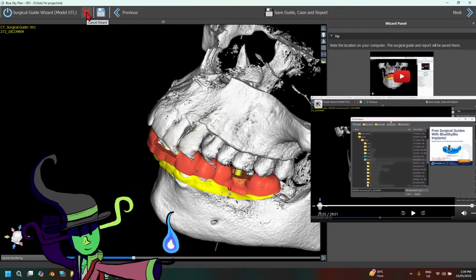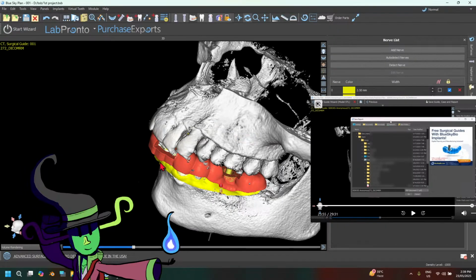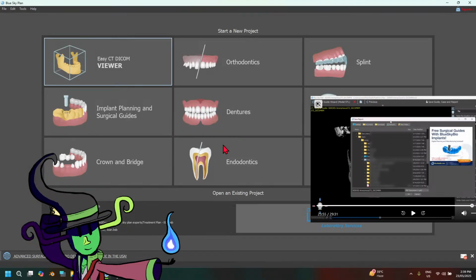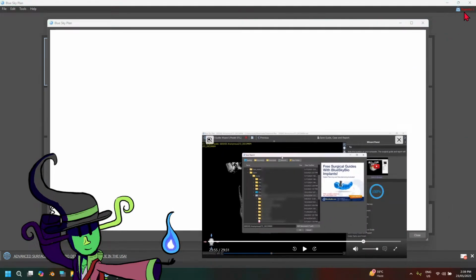And if I exit this out, I can just exit this out, right? Yeah. File, new, save. Okay, nice. All right. What's it say there? Okay.